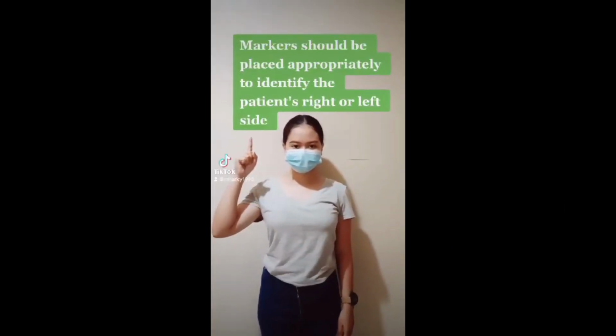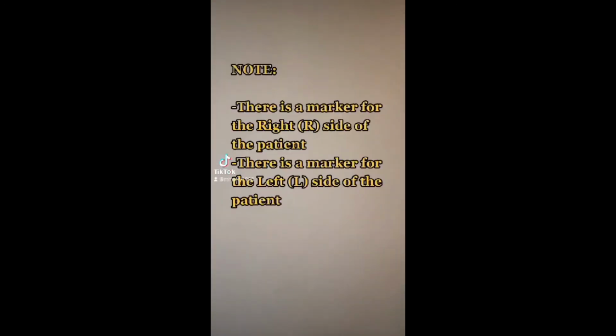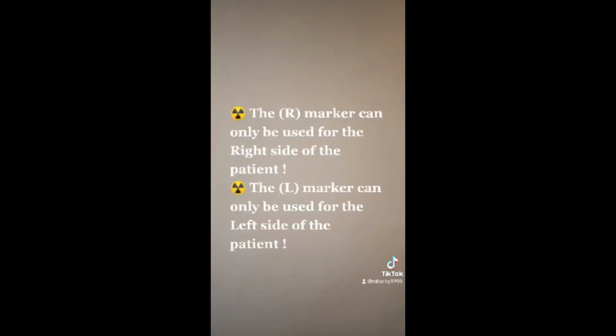Markers should be placed appropriately to identify the patient's right or left side. Note: there is a marker for the right, R, side of the patient. There is a marker for the left, L, side of the patient. Remember, the markers should and can never be interchanged. The R marker can only be used for the right side of the patient. The L marker can only be used for the left side of the patient.